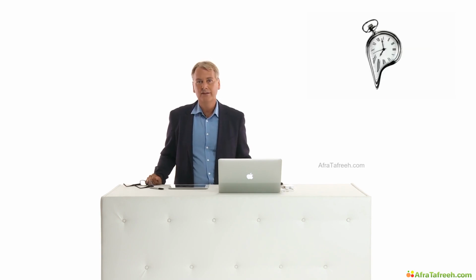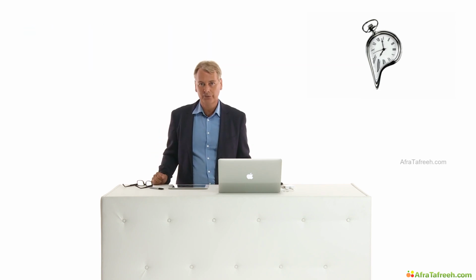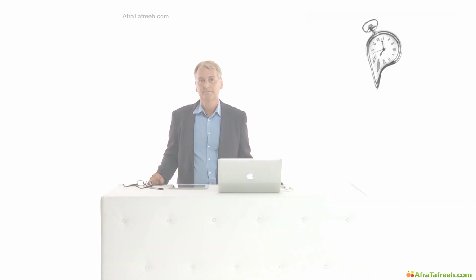So when you have these thrombi, it's important to also follow these thrombi along and compare it with the previous exam so that the referral doctor also knows what the change in the structure of the thrombus is. Does it get smaller? Does it start to dissolve? Is it now less mobile? All these factors are very important for decision making.